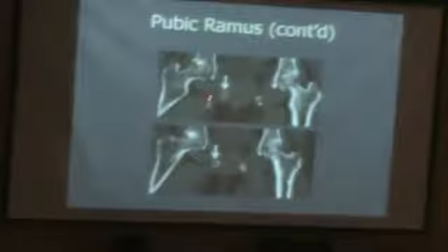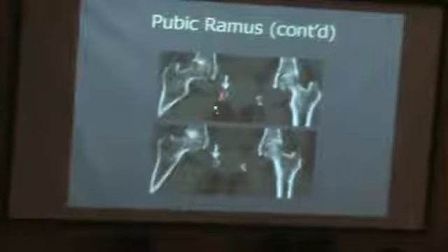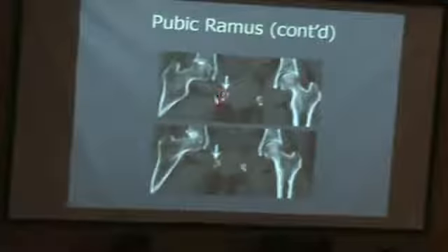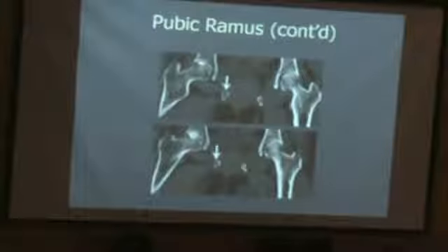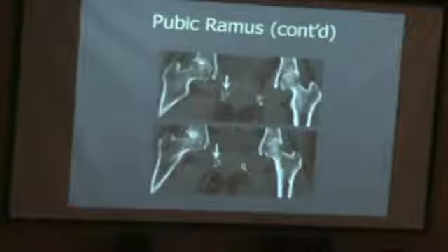But when you look at the CT scan, you see a line fracture here, not subtle at all, but of course without displacement, you see the line of fracture on the pubic ramus, and that's obviously a not subtle fracture, I would say, on CT, but it was not visible on the X-ray.